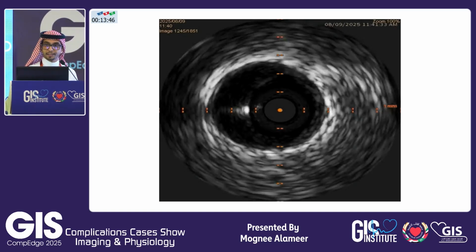So definitely there is a plaque which is hypoechoic. Differential diagnosis would be maybe hematoma, which is unlikely. Usually a hematoma will be hyperechoic unless there is a connection between true and false lumen with a flushing of contrast or saline. Then you will have it hypoechoic. Or it's a high lipid burden with necrotic core. So this is a vulnerable plaque, actually.